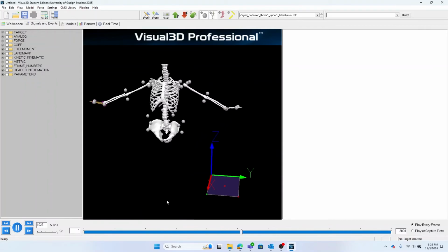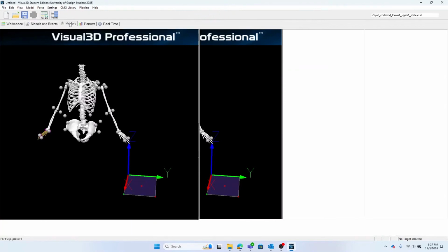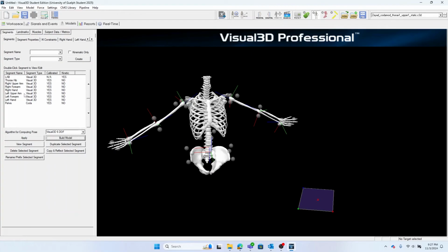So sometimes, I'll say this right now because I've seen this a lot. Sometimes you have the elbow or the wrist just going at different angles and it's all acting weird. This doesn't look like an arm. It looks like half an arm or whatever. If you're in this boat right now, if this is what you see on your screen, then consider doing the following.